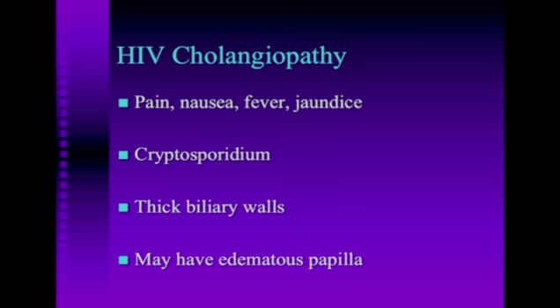In these patients, they may have pain, nausea, fever, jaundice. It has been associated with cryptosporidium. There may be thickening of the biliary walls, and the papilla may also be edematous.